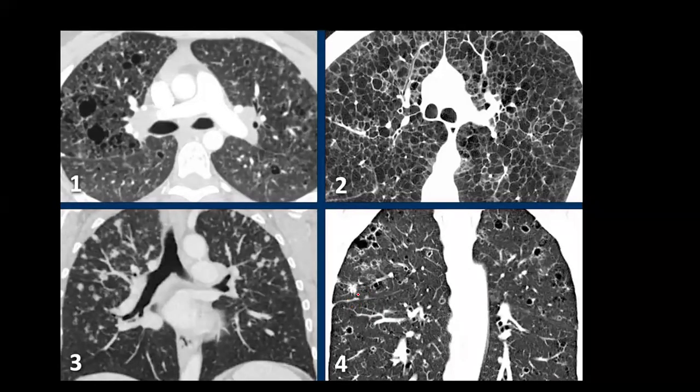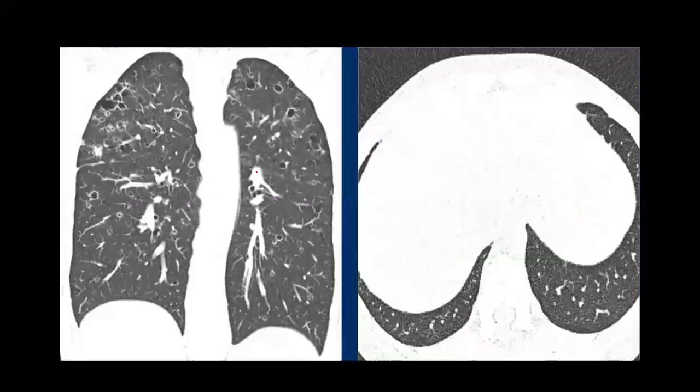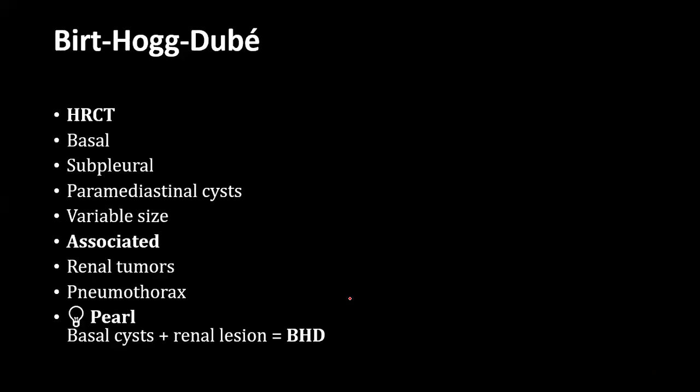So this is basically LCH. Next, again bizarre shape cysts are shown with sparing of lower lobes and the CP angles. So it is again LCH cases. These are CP angles being shown to show that these cysts are not in the periphery or in the lower lobes.